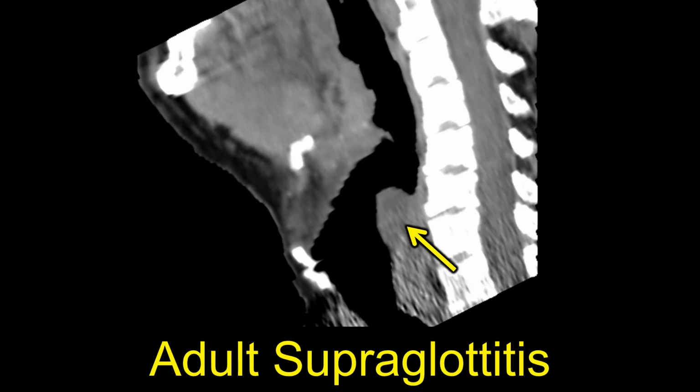The larynx is kind of unique in terms of head and neck anatomy because we have this cartilaginous framework, and the mucosal surfaces are draped over that framework, making all these folds and air-filled spaces that we discuss as anatomic subunits. So we should have a thin line of the aryepiglottic fold here, and here we see kind of a thumbprint. It's a big, boggy appearance at that level. So it's a good appearance for adult supraglottitis, infection of the supraglottic larynx in an adult.